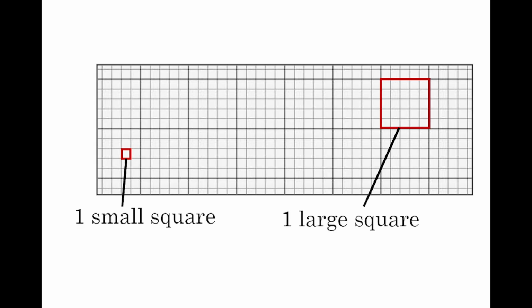The ECG grid typically contains thick and thin lines. Thick lines represent large squares and thin lines represent small squares. One large square contains 5 small squares.